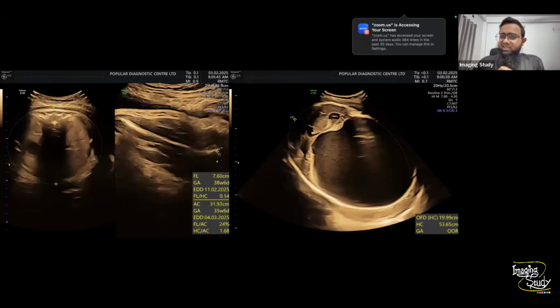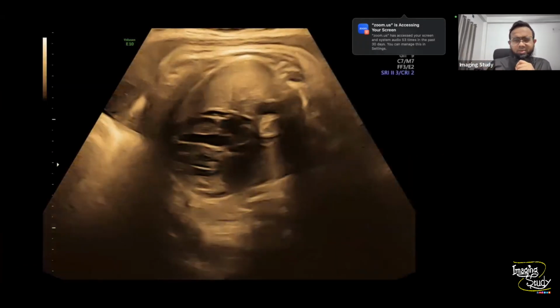So we couldn't measure the BPD in this patient because of the unavailability of the regular normal view. And obviously, we tried to measure the head circumference with our own interest. You see, the head circumference was 536 millimeters. This is a huge size head. I have never seen a head like this before. So I don't know how they will deliver this case. Anyway, the abdominal circumference was quite lower than our femoral length, though the measurements were not very accurate because the positioning of the baby was not very satisfactory, but still we tried to measure something.